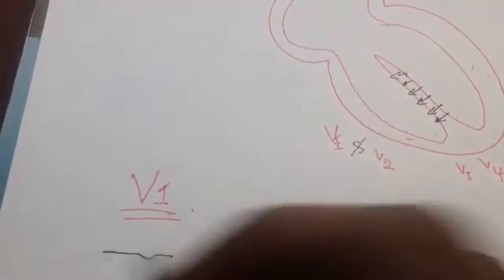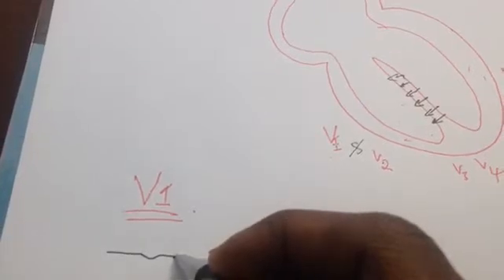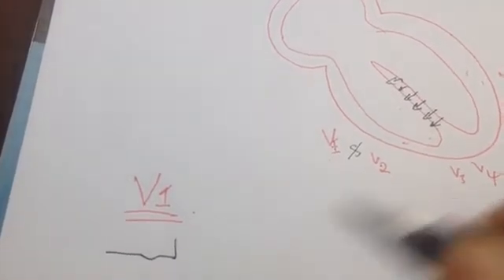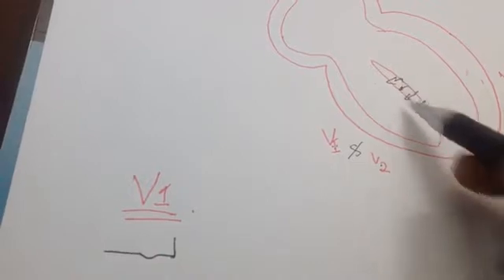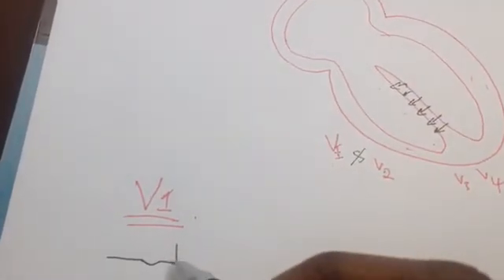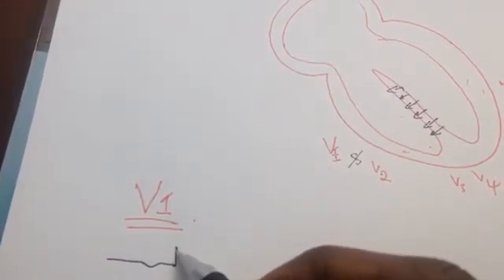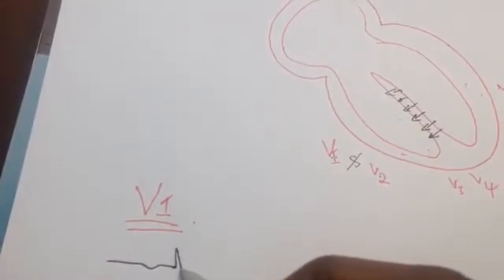So this will show a positive deflection, but it is going to be very small because the septum is small in size. We have already said that the first positive deflection is the R wave. So this is the R wave of this lead.